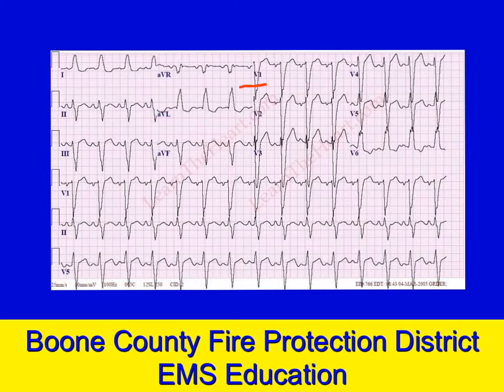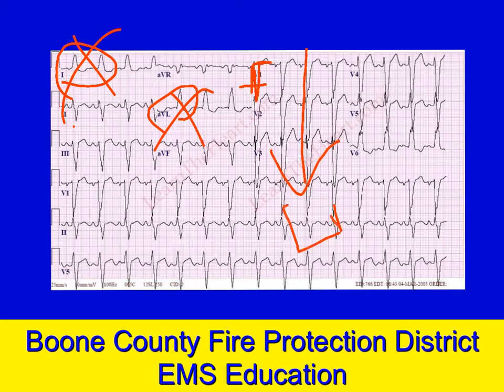Again, lead V1, ignoring any other leads, particularly lead 1, lead AVL, you can't use those. Using V1, finding the J point, moving backwards, it points down, which makes a left bundle.